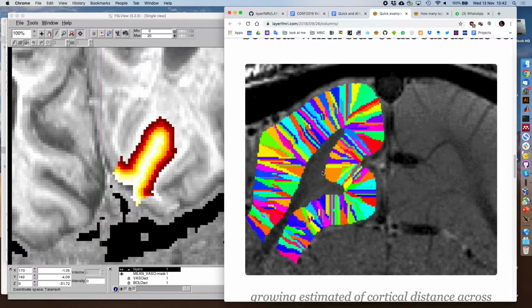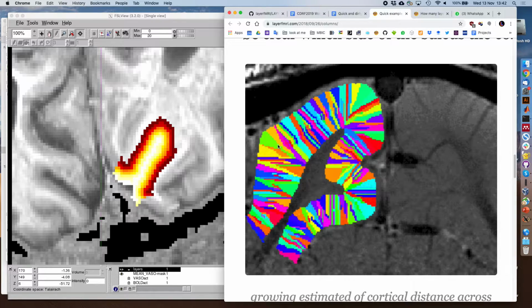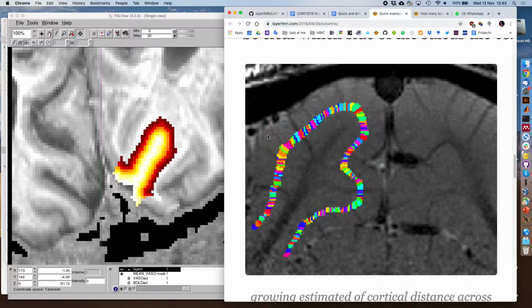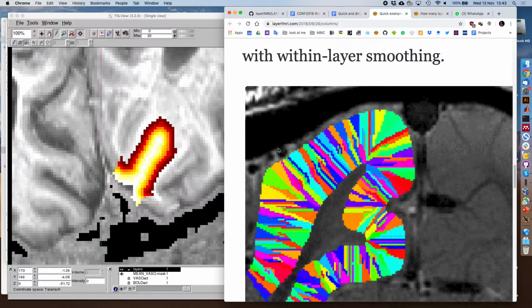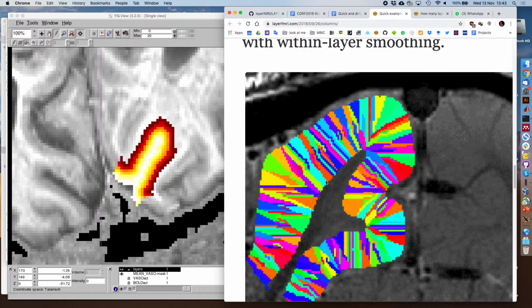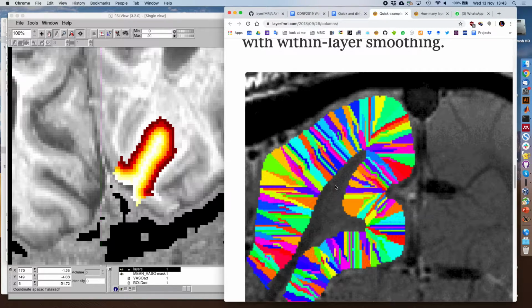Next, I extend the distances to neighboring columns, which can look like that, based on a nearest neighbor algorithm. This nearest neighbor, however, has the problem that, again due to Pythagoras, it sometimes has amplifications. Like here, all these green voxels have the nearest neighbor of this one, and it looks like the orange one disappears. So this is, again, corrected to have columnar consistencies in the next step of the algorithm, which then looks like that. And this is basically everything that we need. Now we have columns or layers. The algorithm is the same in this voxel grid.